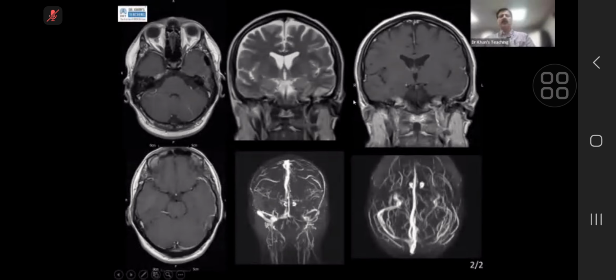So, what is happening on this MR? If you can concentrate here, concentrate here, concentrate here, this is that gas locule. How will you tackle it? What will you say? Over to you.